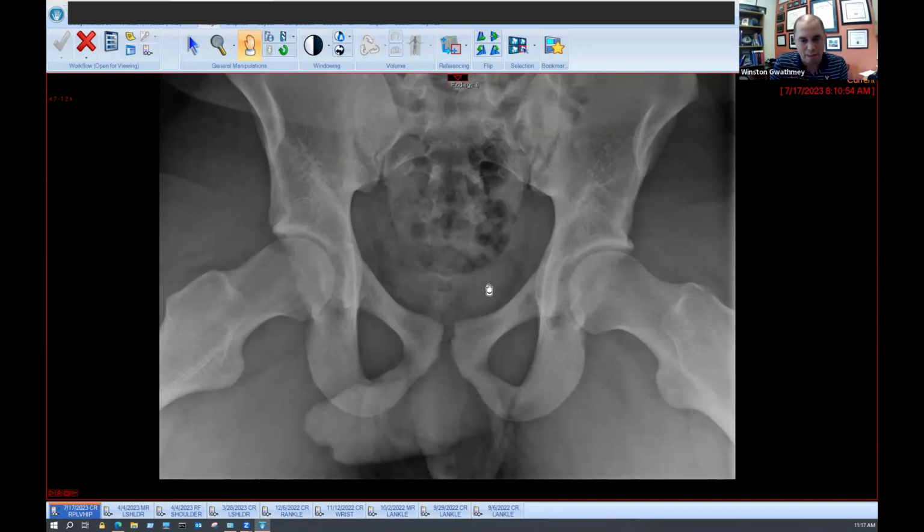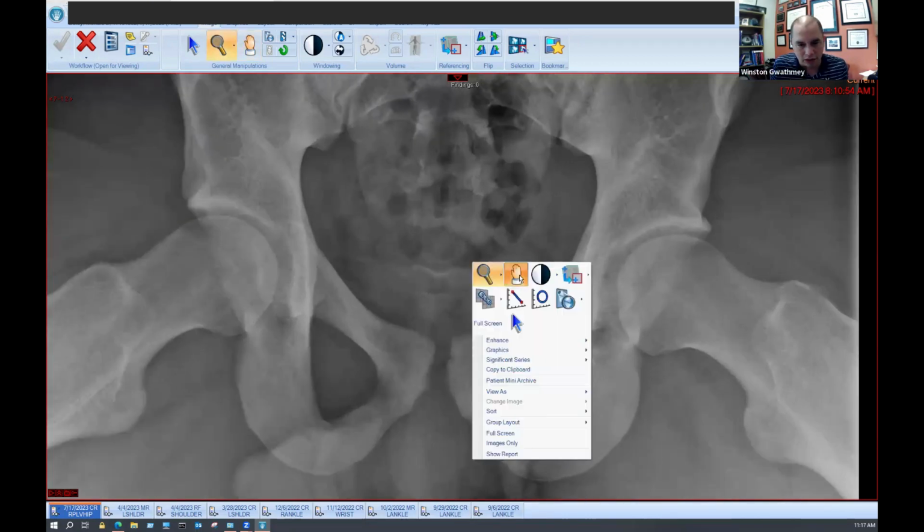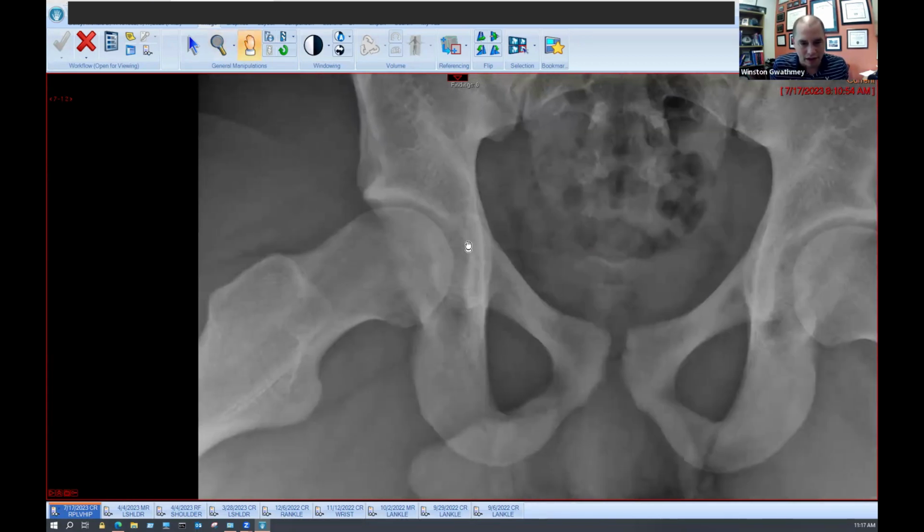And in the postoperative setting, you actually can see what your femoroplasty looks like compared to what the native femoral morphology is. Okay. So in this one, we can actually zoom in. Again, we'll choose the right side. The right side is the one in question.